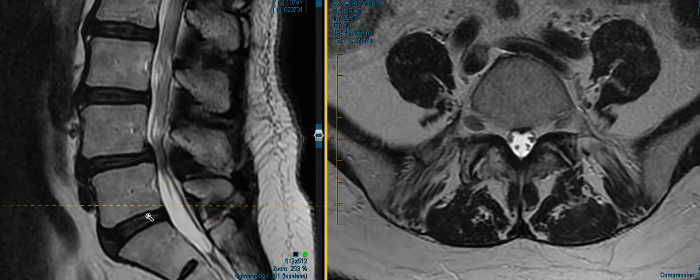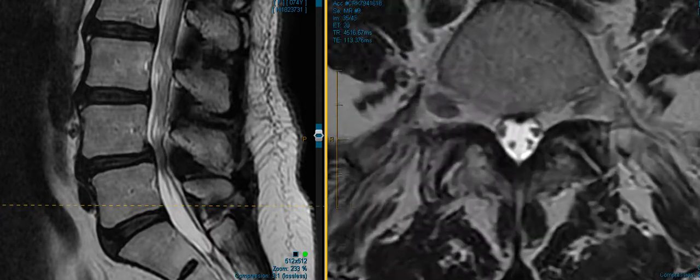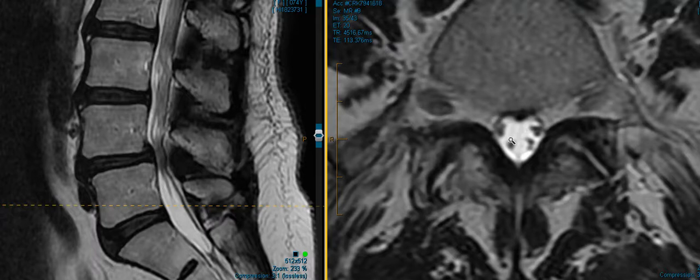This lowest level is the L5S1 level. It looks pretty healthy. There's something going on here at the L4-5. You can see that these vertebrae are just minimally malaligned. I've got this cross-sectional line down here over more around the 5-1 disc. You can see the spinal canal, this little roundish, whitish area. That's where the nerves lie. These little black dots are the nerves. And there's nothing pinching them, nothing compressing them.